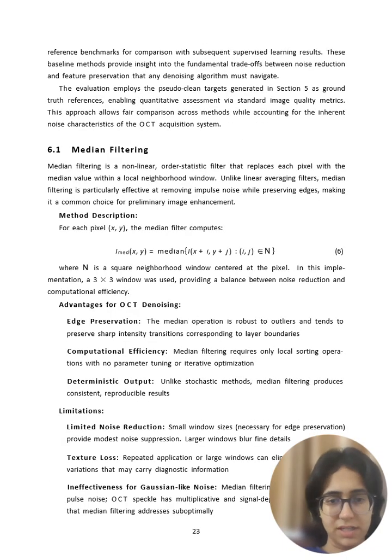Median filtering is a non-linear, order-statistic filter that replaces each pixel with the median value within a local neighborhood window.